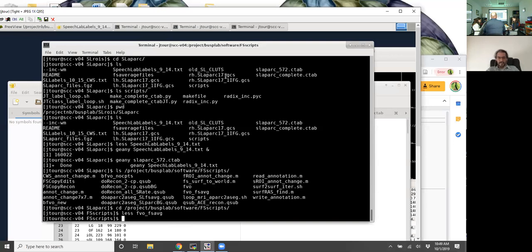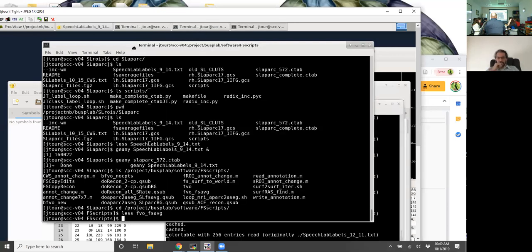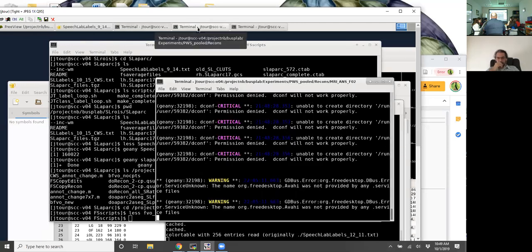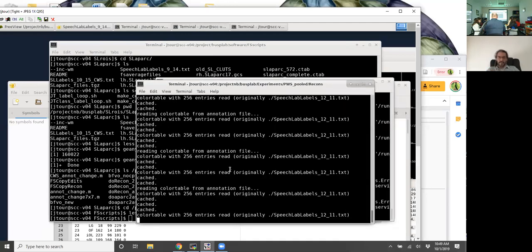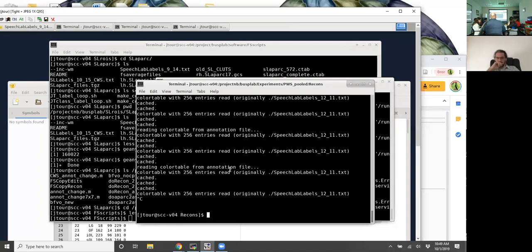Okay, and just as a throwback here, let me see where the terminal is. So remember, the different things that you want to do every time you're going to look at this is you want to define a subject first.